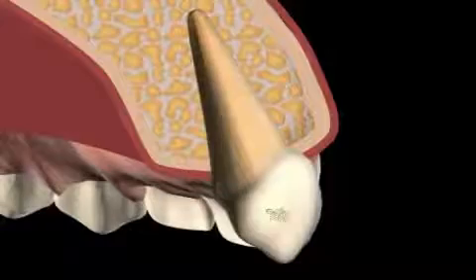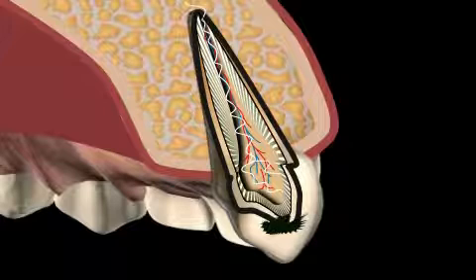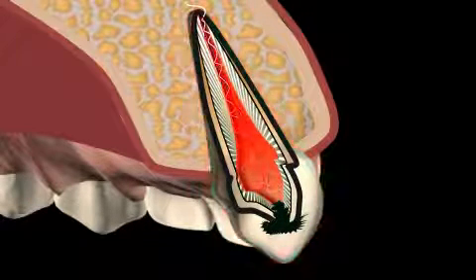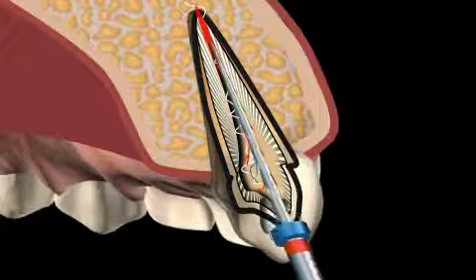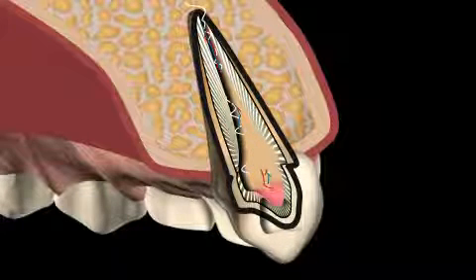In the animation, you see how deep caries, or bacteria infecting the tooth nerve, cause you to experience pain, resulting in necessary root treatment. The dentist carefully removes the infected tooth nerve material, which is also known as endodont, and then finally seals the canal with a special material.